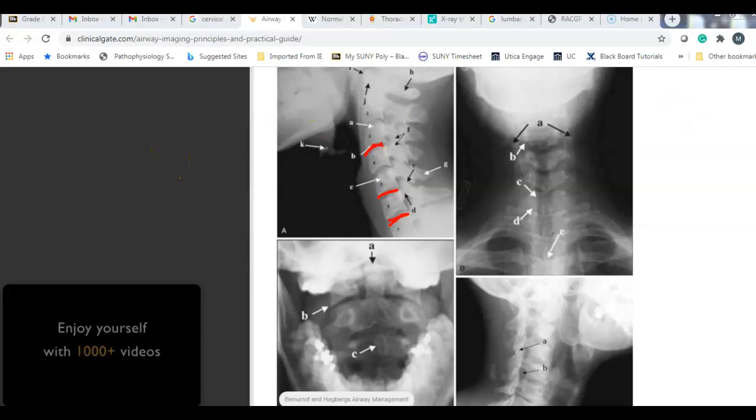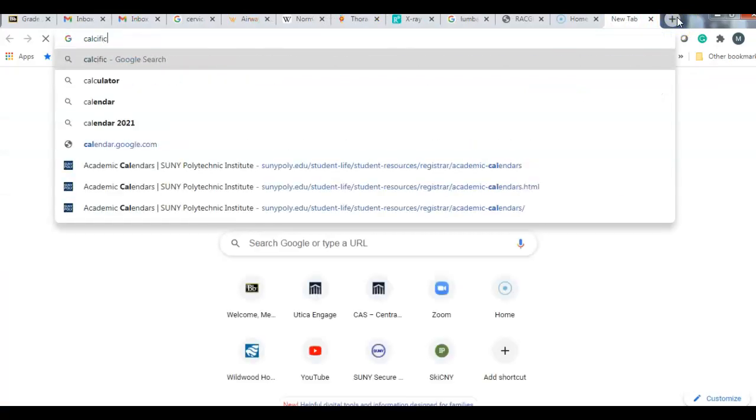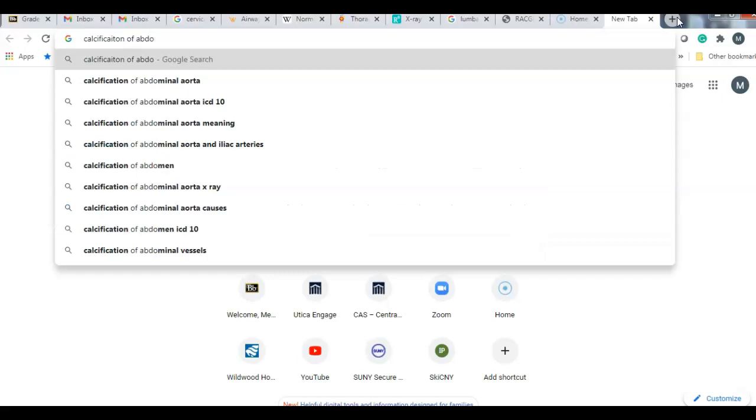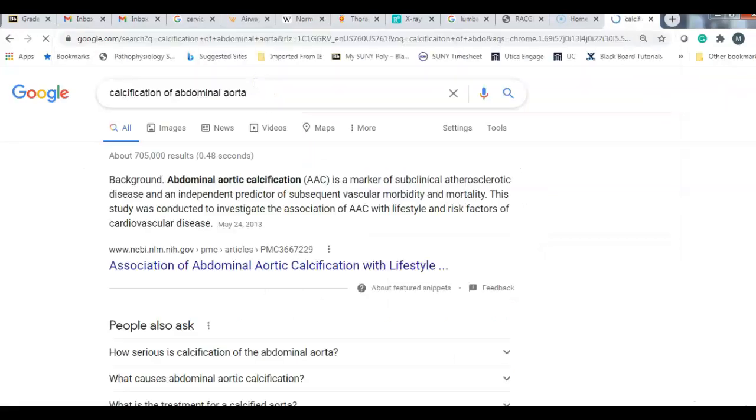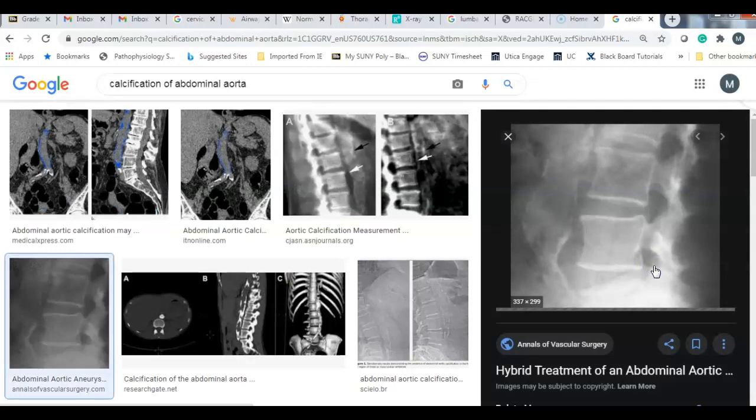I had a patient, let me see, hold on a second. Let's see. I had a patient who, unfortunately, didn't listen to me about this. And you could see right here, he came in, gosh, I don't remember by now. It was almost 20 years ago. Lumbar, whatever.